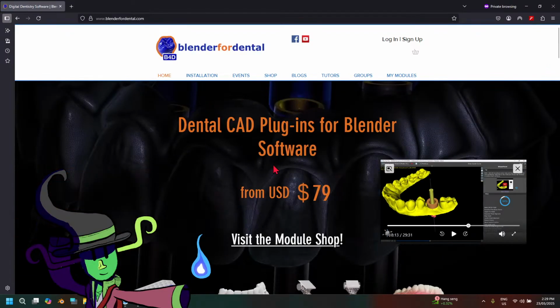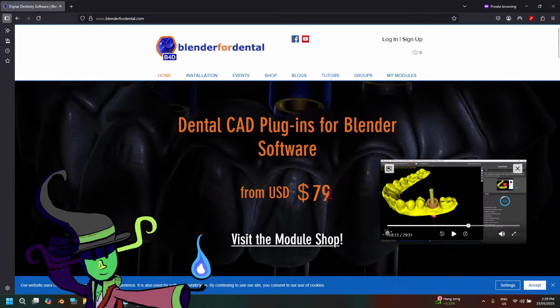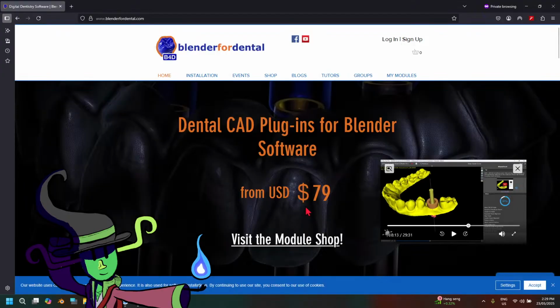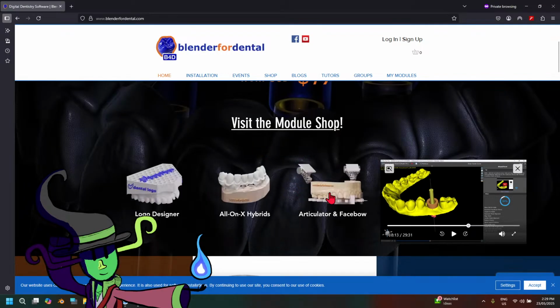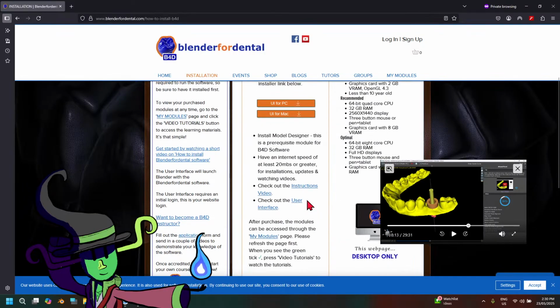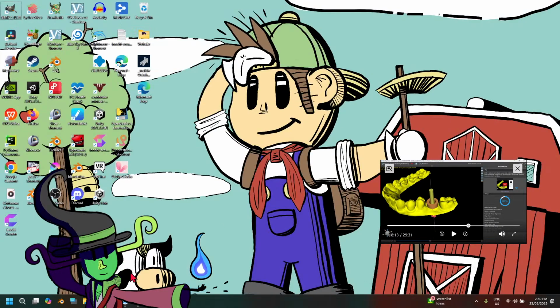Alright. Yeah, I think Blender for Dental to me is a better bang for your buck than whatever Blue Sky Plan is doing, technically. But you do have to pay for the software first before you can download it. Let me see. Where are their modules? Here we go.